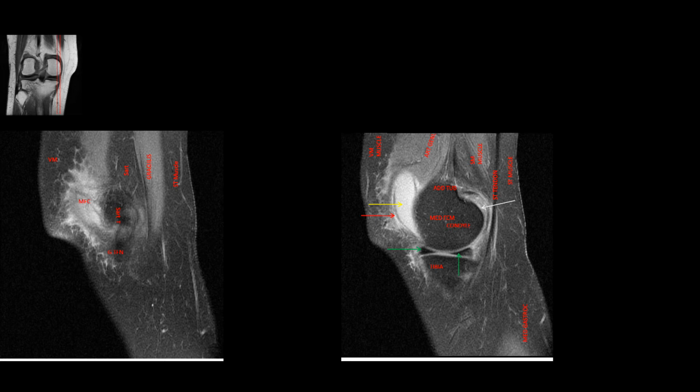And then if you were to go a little further in there, you see the medial femoral condyle. This would be more of your first cut here. You can see these different slices of the anatomy here. So you see your tibia and gastroc and semitendinosus muscle here. So you can kind of get an idea of what you'd be looking at with the knee here.